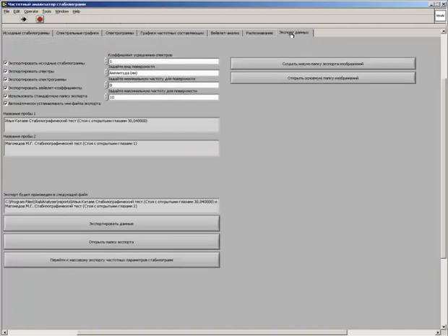Finally, to ensure the accompanying statistical analysis of stabilograms, spectral densities, the characteristics of spectral curves and the wavelet coefficients, the export of these data can be implemented. Before export, one can set parameters of calculation such as the coefficient of spectrum's averaging or the frequency band for spectral density surfaces, and then start the export. I have briefly talked about all the capabilities of the developed software.